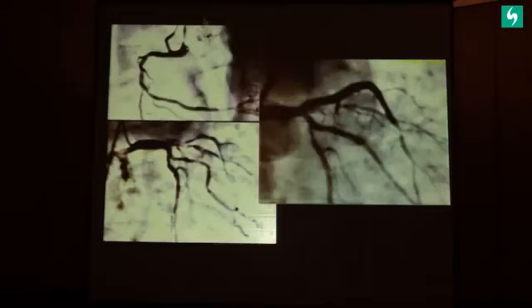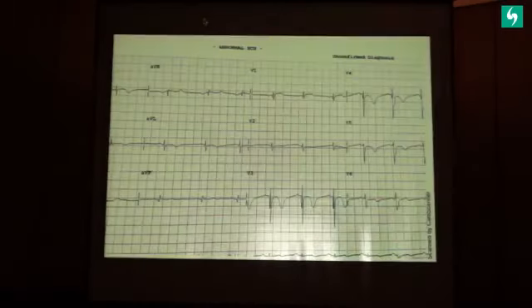This is after the stent. This obtuse marginal is after the stent. So this was clear that I just implanted 2 stents. Creatinine was 2.3, so I didn't bother about the right. So after these 2 stents, look at the ECG. The right bundle is gone.